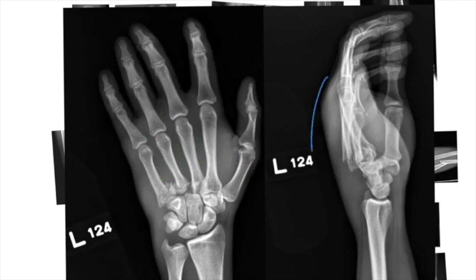And notice the severity of the soft tissue swelling. Sometimes it's hard when you're looking at radiographs to really appreciate the extent of the swelling. A good thing to try is palpate this area on your hand, and you'll see that for most people you push right down onto the bone, and you can imagine with this degree of thickness it's going to feel kind of squishy there. So that is clearly swollen.